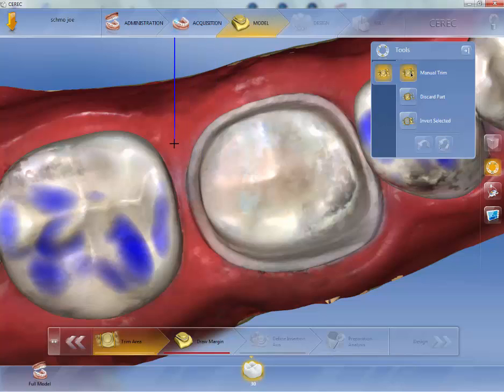So I'm going to start up here, and you can see it's very easy to do because I've opened this up by just moving and blowing up the restoration. I start with a double click. Now it's a double left click, and it's now locked where the cursor used to be. You can see how the blue line is moving around. We're going to ignore that.